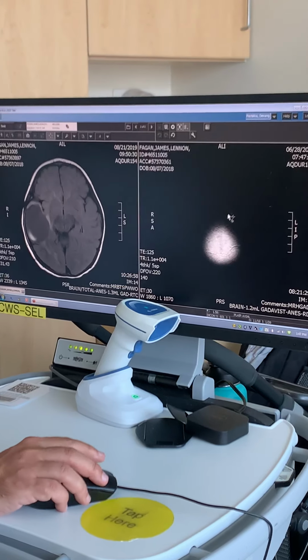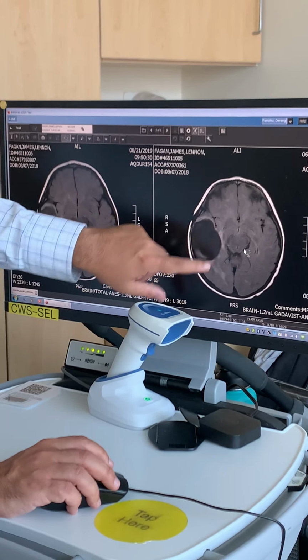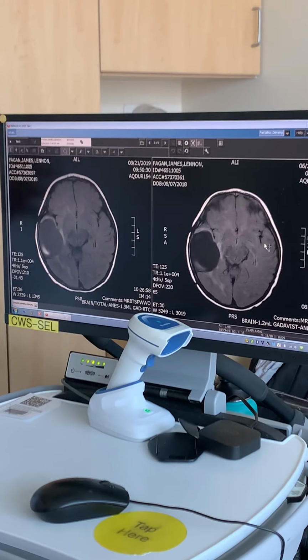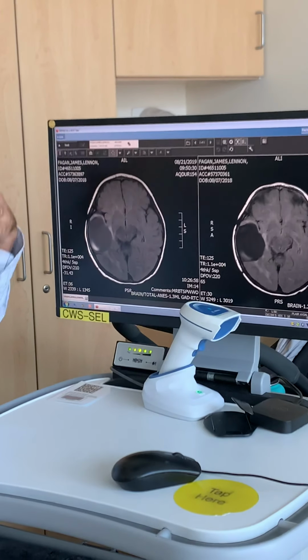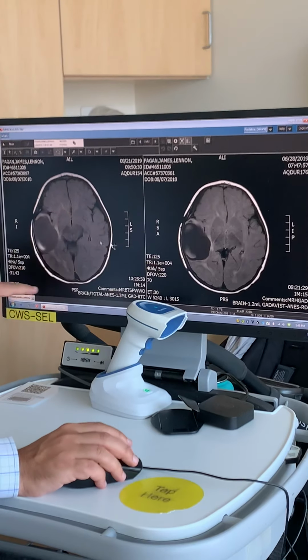So when you look at it with this one as well, compared to the old ones, there's more brightness around, but this is just because this shows a little bit more of the impact of the surgery itself. Not saying that his brain is not functioning over there, but you just get more of this scarring from it. It just shows it to more of an extent.